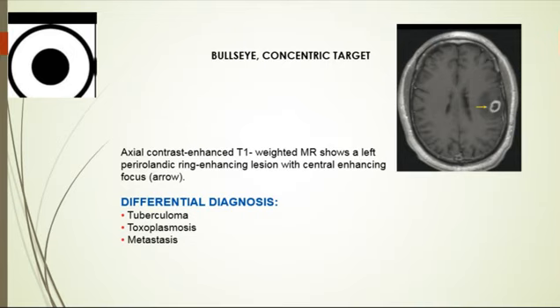Toxoplasmotic brain lesions are usually multifocal with rim enhancement, larger irregular nodules representing a combination of inflammation, hemorrhage, and necrosis. In the cortex and deep gray matter, the nodules tend to be eccentrically located, the asymmetric target sign in the periphery, okay? In the deep gray matter, in the central part of the brain, usually the nodule is eccentric, okay? Asymmetric target sign, which pathologically corresponds to necrotizing abscess and penetrating vessels, eccentric, okay?